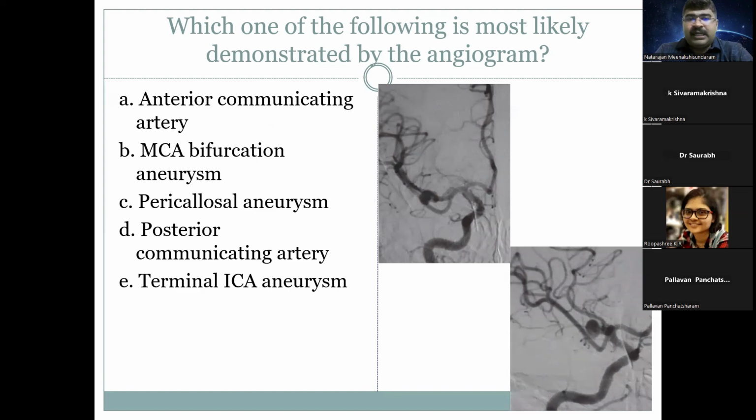So which one of the following is most likely demonstrated by this angiogram? Hope I get some replies for this question now. So I've explained to you in brief about the cerebral angiogram. So you should be able to tell what you are seeing here.